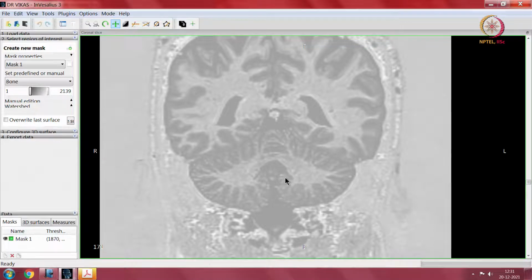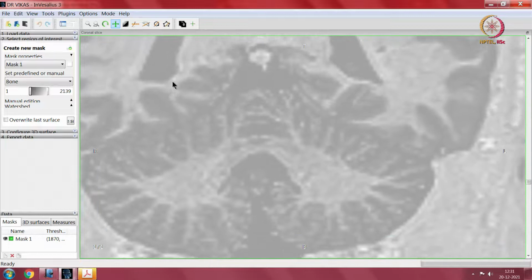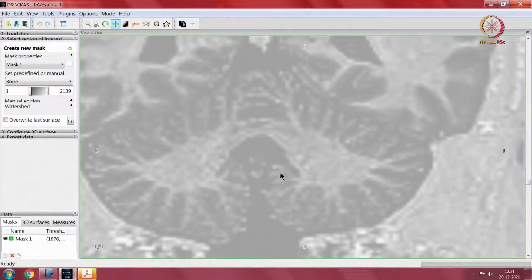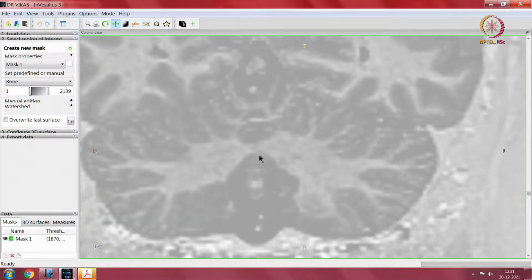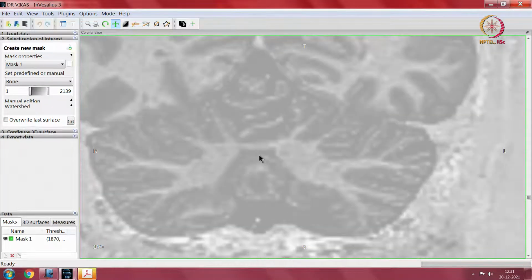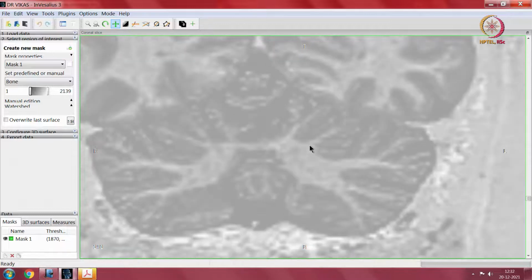With these structures, this thing over here you can make out is the uvula. It is seen differently on the coronal section. The uvula is the center, with the side structures, and this is the tonsil. The tonsil continues into the vermis. So, how do I show the vermis? Yeah, these things are the vermis. It is quite different from the hemispheric structures, which have white matter in the center and grey matter in the periphery with the cerebellar folia.